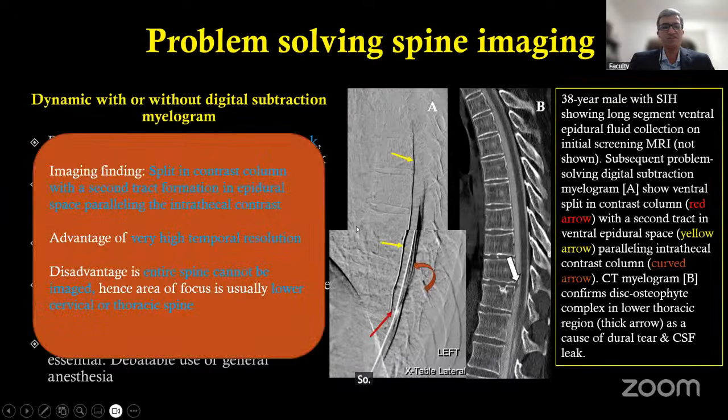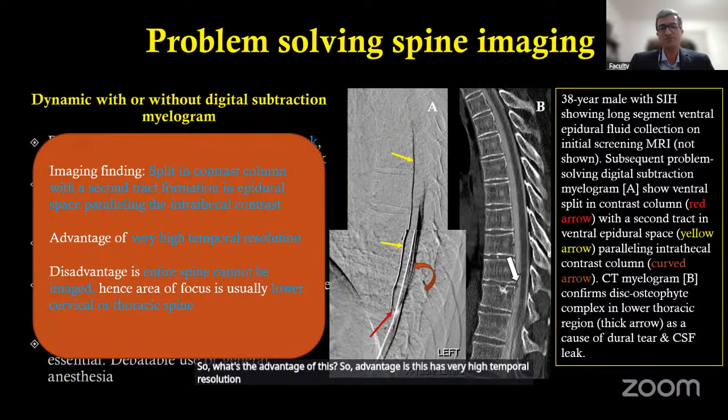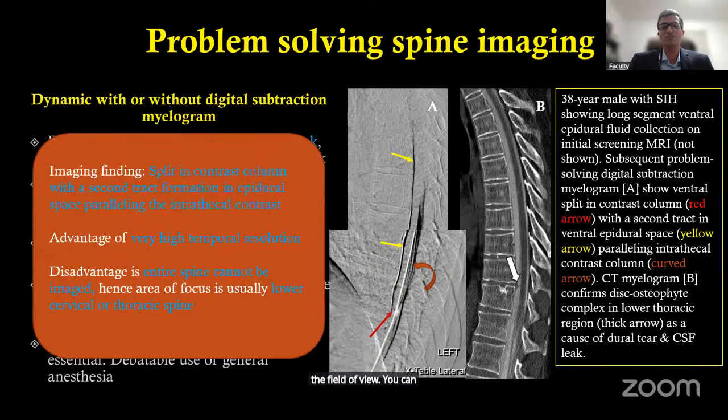So what's the advantage of this? The advantage is that it has very high temporal resolution, and you don't miss any of the leaks if the study is done properly. But the disadvantage is the field of view.